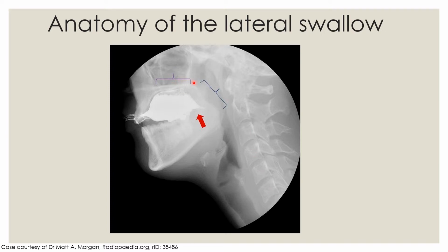Gaseous structures allow more X-rays to pass through, and so what you can see here is the pharynx, and the trachea here, and that contains gas, and so most of the X-rays are passing through, and everything else around it, soft tissue, fat, muscle, appear different shades of grey.